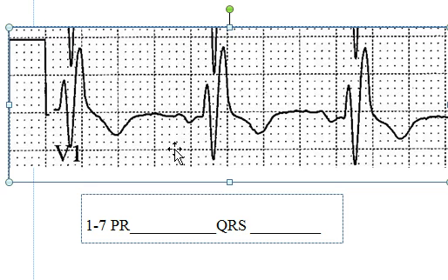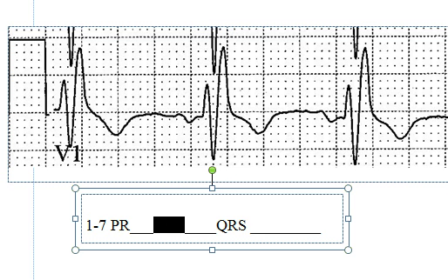To measure this PR interval, you'll need to start, here's the end of the T wave, the ST segment and T wave here, and then we have our flat line, and then this right here is where that P wave starts. So we're going to start there, and we're going to measure it until the beginning of the QRS, which is very easily looked at and visualized. So looks like we have 1, 2, 3, 4 little boxes. So I'm going to say that the PR interval is 0.16.